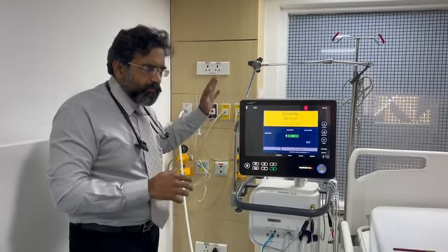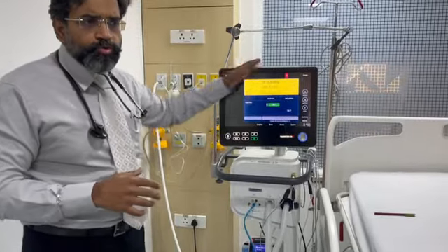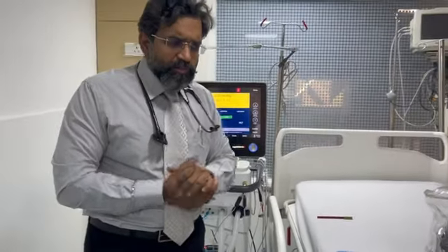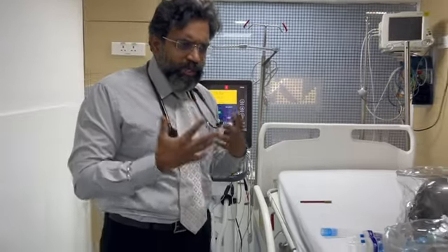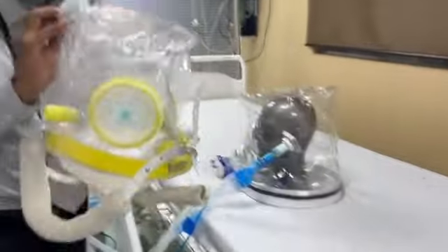Here at this moment we are not showing you the blender per se, we are not using the blender. We have just kept the ventilator over here and we will show you how to use it with a high flow. It's very different when we are using it with a high flow versus when you are using it with a ventilator. How does the interface look? The interface looks something like this.